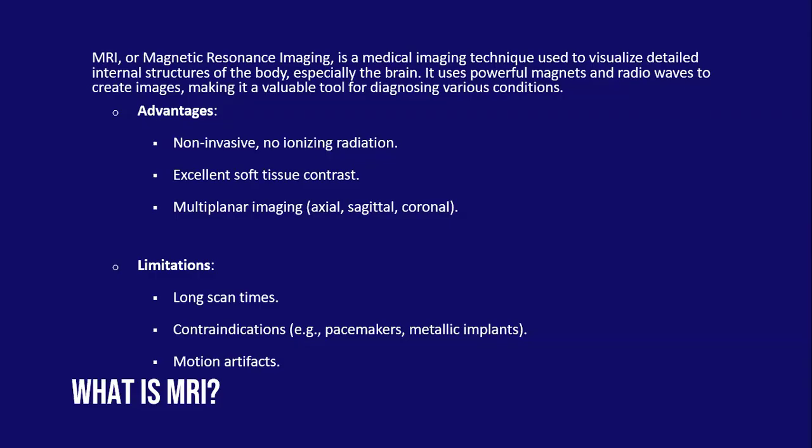That's the word we use in MRI for what is projected on the screen. Then you can do imaging in various planes, which are axial, sagittal, and coronal.